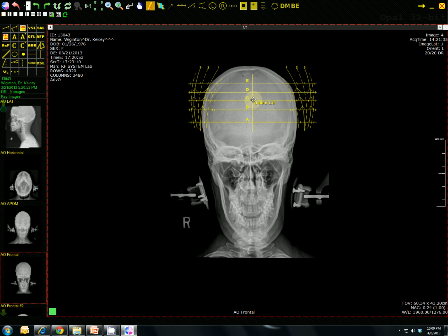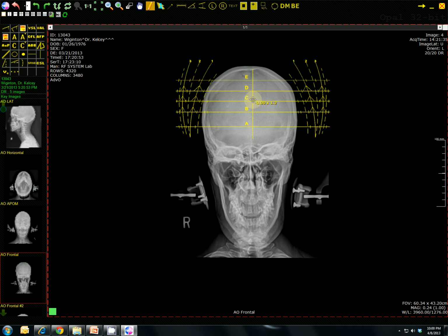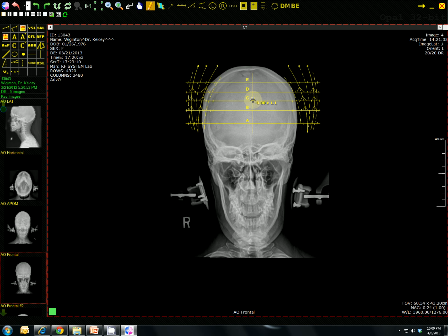So that's where the greater than and less than symbols, or if you look, it's also the period and the comma button, can actually start to rotate this template. Sometimes though the template is either too large or too small for the person, so if you press the plus button to make it bigger or the minus button to make it smaller. It's very useful for different situations.